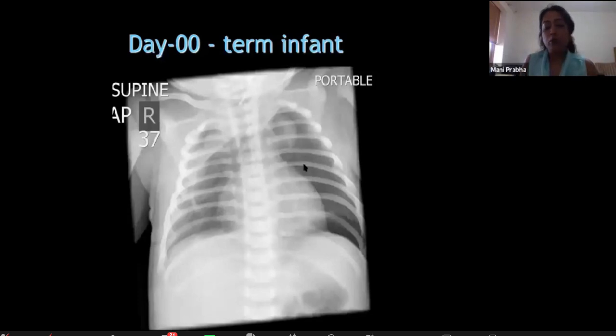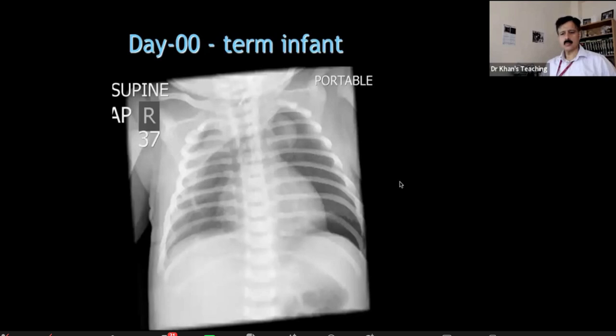Okay. So I've included it as a companion case. Just sometimes it can cause mediastinal shift also. So when you are describing those surgical conditions which we discussed just now, keep pneumothorax also in mind. That can be one of the differentials.